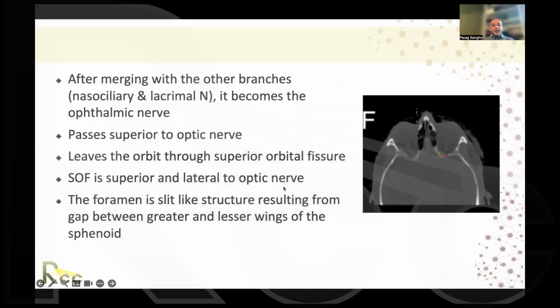And what you will see is that typically as you're contouring these, you're going to contour just entrance and exit, and then you're going to cover all of that area. So don't spend a lot of time contouring inside the orbit, just contour the foramina. If you can contour the superior orbital fissure, and you can contour the entrance of where this is coming, you're literally just going to cover all of that retrobulbar fat space, because the tumors can really crawl right along there. And you can see the optic nerve is going to be right in the field for you.